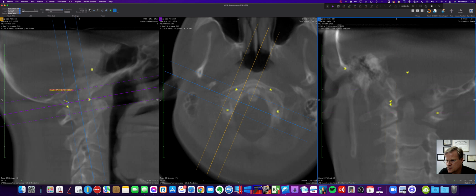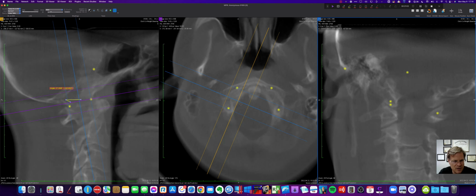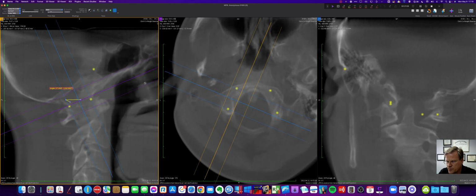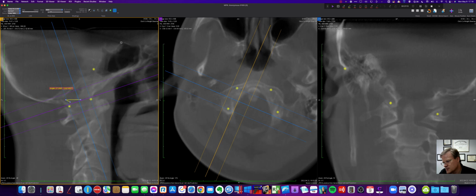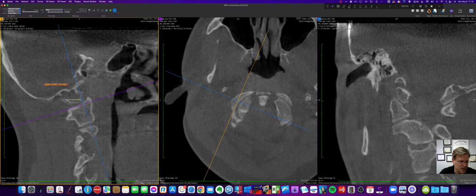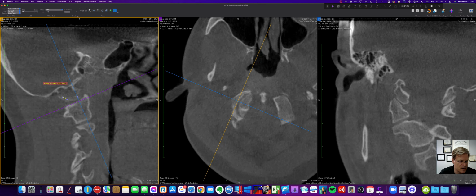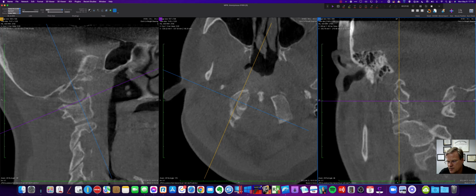A nice long styloid process. I'm going to move it back and forth. It looks fairly lined up. Now I'm going to move this. Let's see if I can get a clearer picture. No, not necessarily. Okay. Still looks pretty lined up. Let's take a look. Let's go back here. Now, let's bring this up to here. It's right there, looking there. That's looking quite a bit like an ASL.